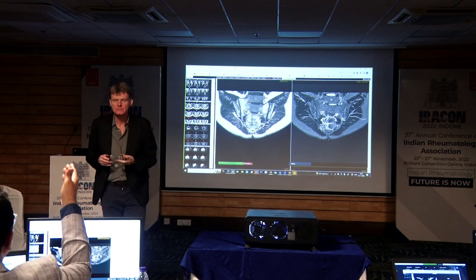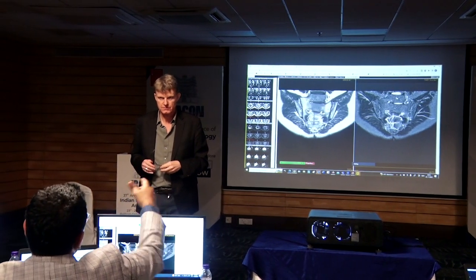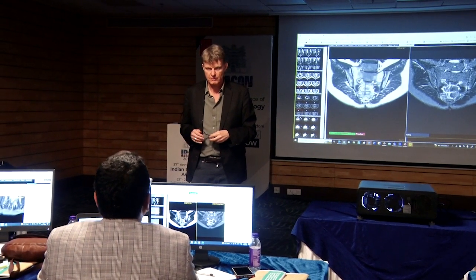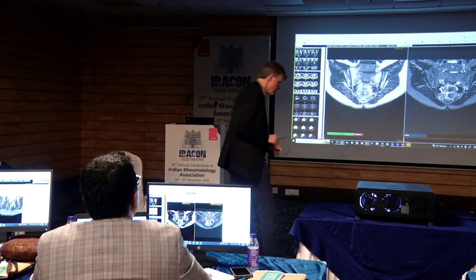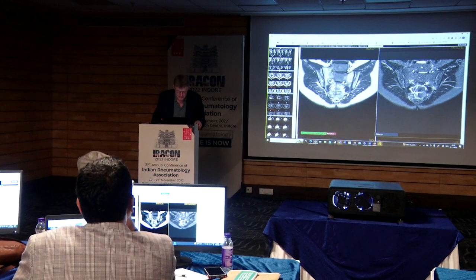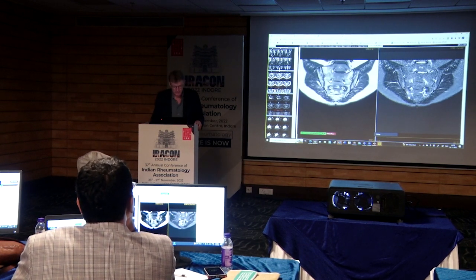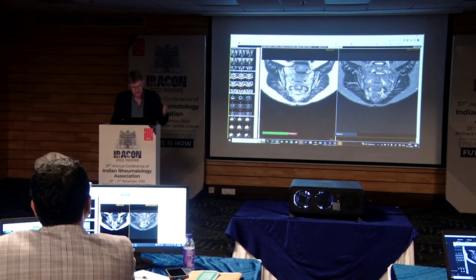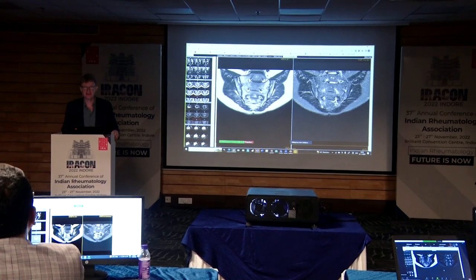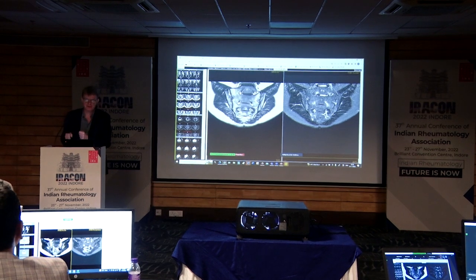Yeah, but would the backfill have erosion, sir? The so-called backfill which you are committing on the right side also has a lot of irregularities of the actual erosion. So is it actually backfill or fat, sir? Yeah. So the question is that when we go back to this area here, you do have the sclerotic line, and it's accepted that this is backfill, but you say that the surface of the backfill area is actually also irregular. And is that then erosions?